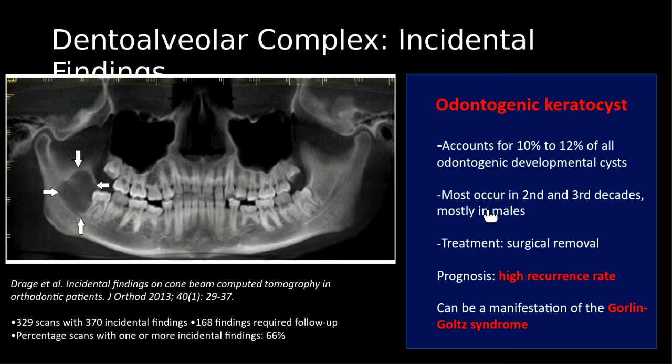I typically don't like this kind of cyst, OKC, because it tends to come back and recur, and when recurrence happens, it's not fun. So whenever you see OKC, be alert, because it has a high recurrence rate, and you don't want this to happen.